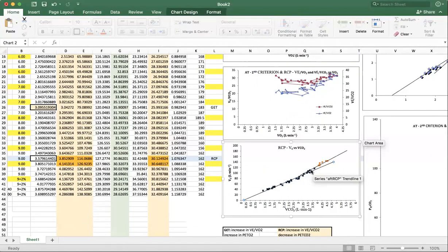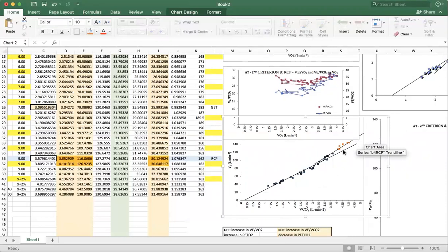But again, we have some data points that are a little bit off center. Like for example, which is this one? Let's just make this a little bit bigger. There we go. 3.85. So if you do a slight adjustment by selecting your data, let's try including that value. There we go. We see a little bit better representation now with our crossover point.